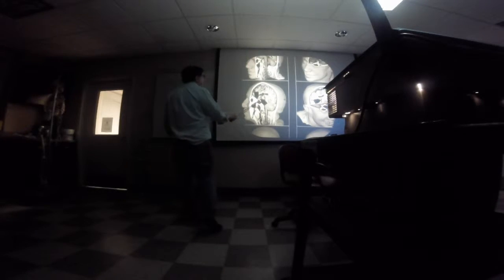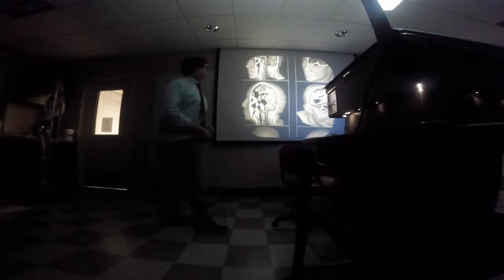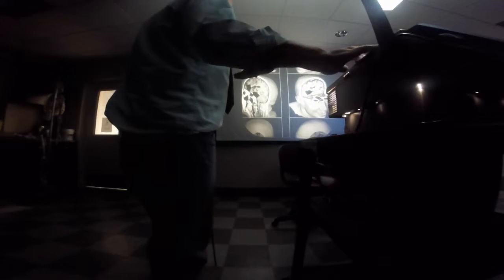What kind of scan is that, Dr. Parker? This is one of these three-dimensional scans. What is this structure here? That's the optic nerve, right? Wasn't that a nerve? It was. No, maybe it wasn't on the other classes. That's not a problem.